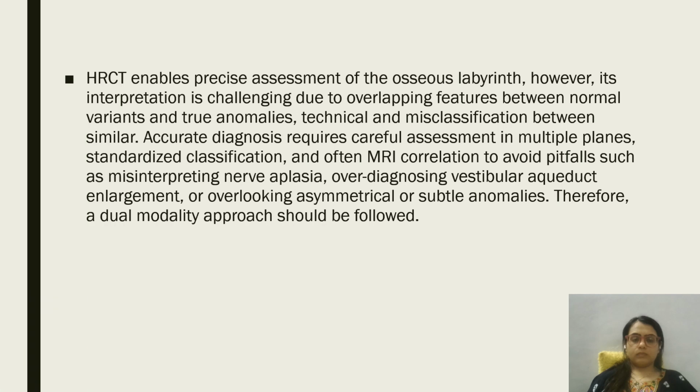Discussion. HRCT enables precise assessment of the osseous labyrinth. However, its interpretation is challenging due to overlapping features between normal variants and true anomalies. Accurate diagnosis requires careful assessment in multiple planes, standardized classification, and often MRI correlation to avoid pitfalls, such as misinterpreting nerve aplasia, overdiagnosing vestibular aqueduct enlargement, and therefore a dual modality approach should be followed.